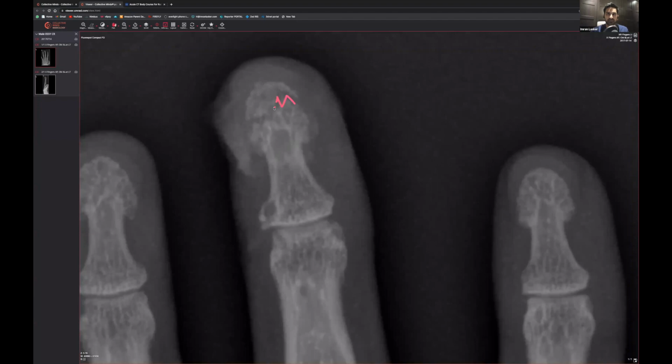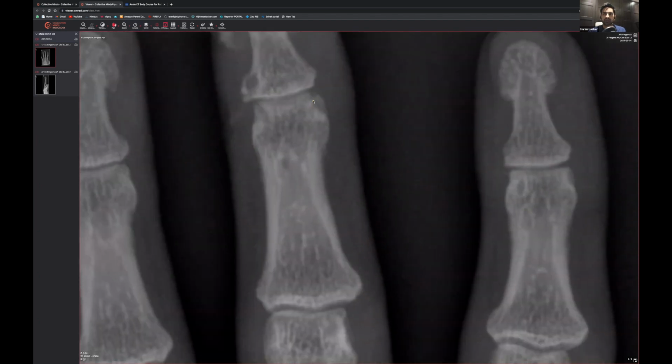And you can see, yep, there's a radiolucency there. And it does look like it's maybe slightly impacted. And yep, there's a fracture. I think this person was actually using a hammer, and they hammered their finger and ended up with that particular injury. So not very nice, is it? But anyway, we still got to keep looking, making sure there's no other fracture.